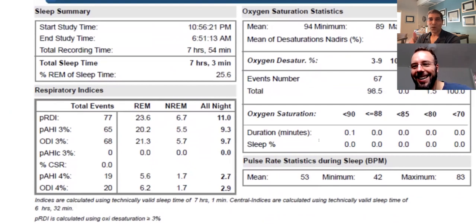Slice it up into 10 WatchPATs and put 10 videos up for those who lack attention. They went to bed at 11 p.m., and this could be me, this is when I go to bed and wake up. Anyway, they slept most of the time, which is good.